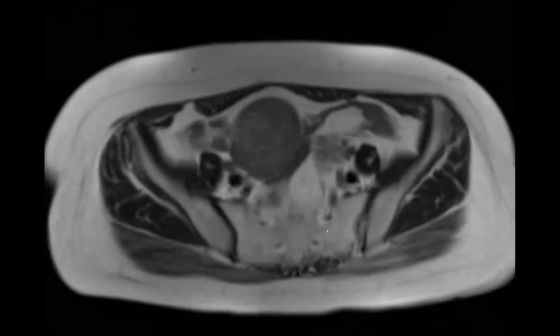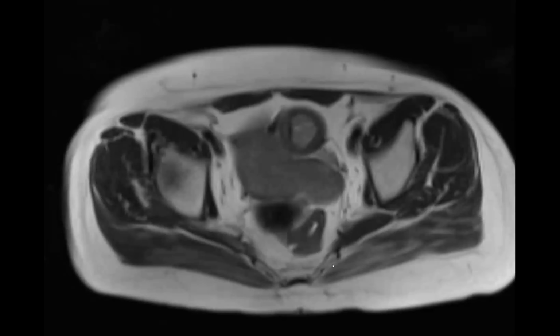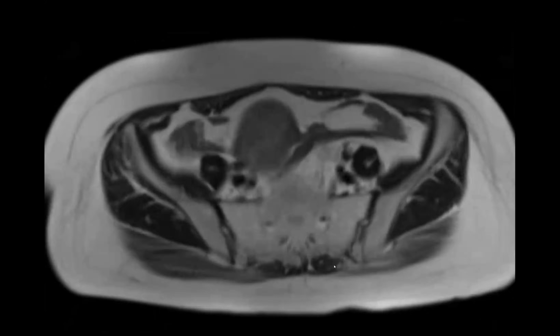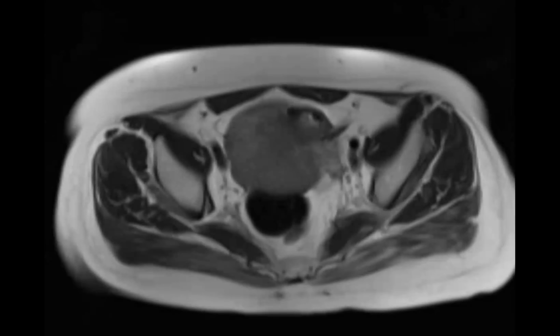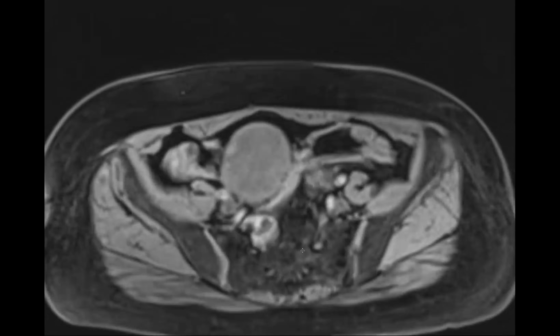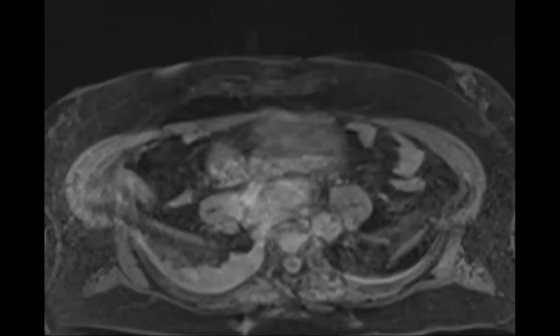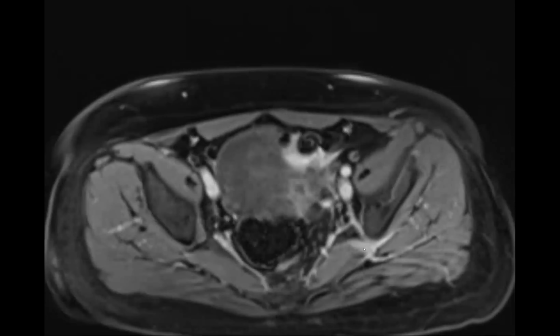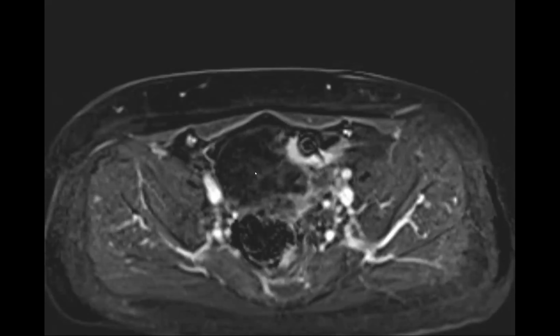Yes, thank you for the MR. That's what we do at Emory, we do a lot of MR. And this is what it looked like on the T2. Looks tubular, intermediate, kind of. This is the pre, delayed, subtraction. Low level enhancement.